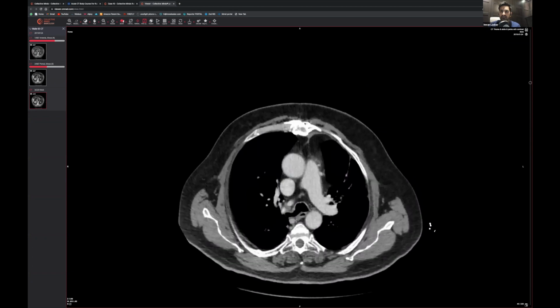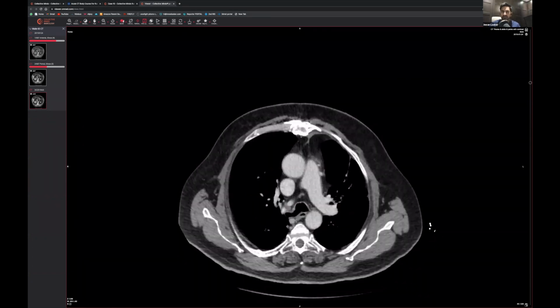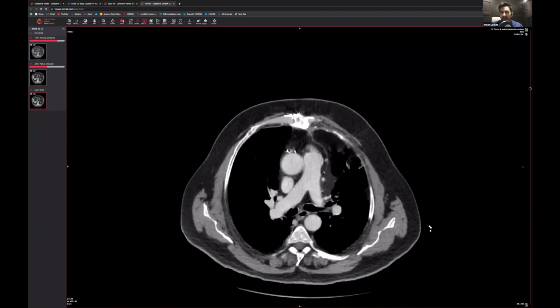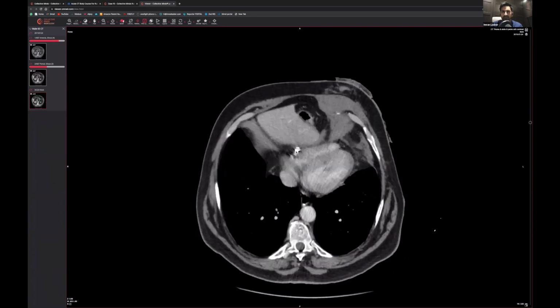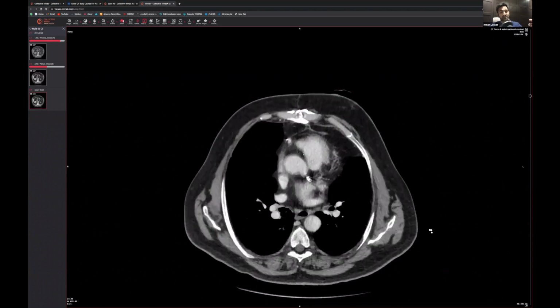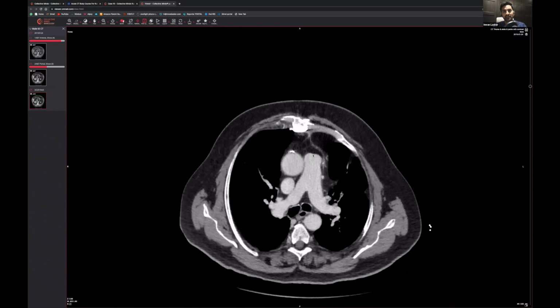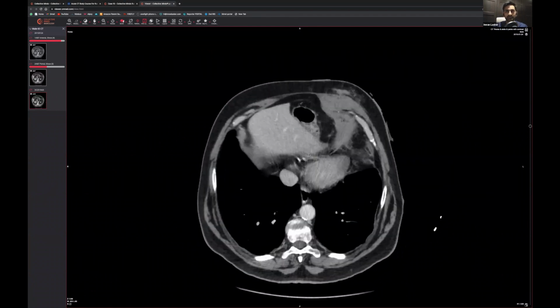They've had some previous surgery, haven't they? Look, you see multiple surgical clips sitting within their sternum. And they've got what looks like maybe some stents, probably had a CABG or something at some point. So anyway, those CABGs look okay, don't they? You can see there's a bit of air located within the region of the ventricle over there. That can be normal because when you're injecting contrast, sometimes some air goes into the heart and into the vessels. So nothing too bad to worry about.